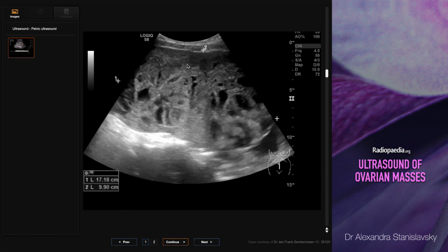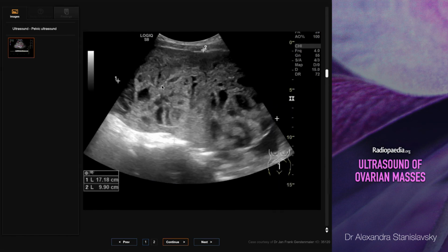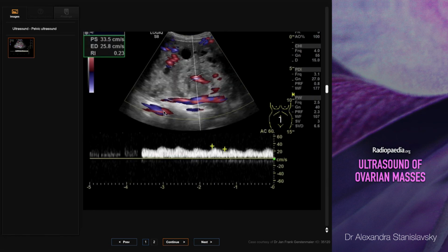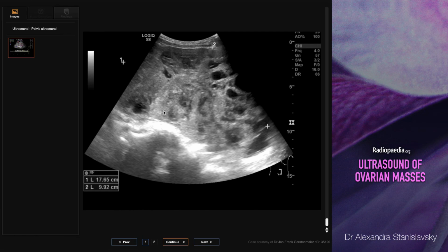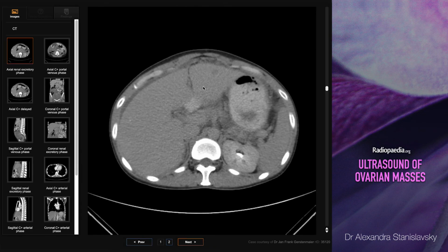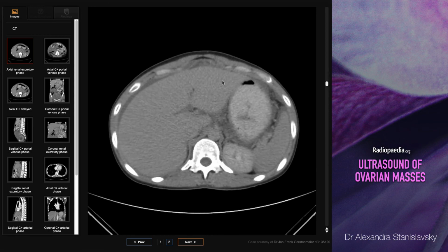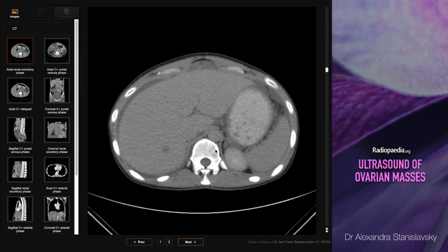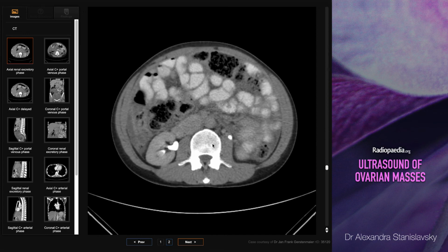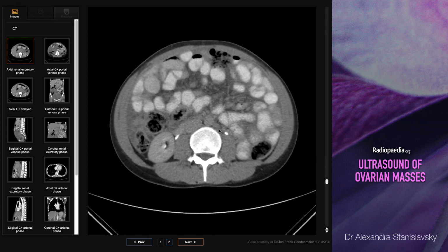So this is either, depending on how you want to call it, a solid tumour, or a multilocular solid tumour. It doesn't really matter. It looks terrible. It's very, very vascular. It's got ascites. And in fact, we do have the CT available as well. There's a few potentially liver lesions which we can't quite characterize on this scan alone. You can see the ascites. She's also got bilateral pleural effusions. Just checking, she's got some prominent lymph nodes as well, lymphadenopathy.